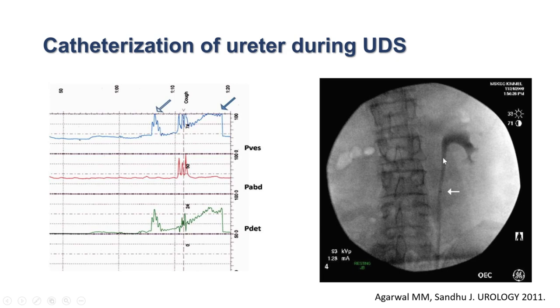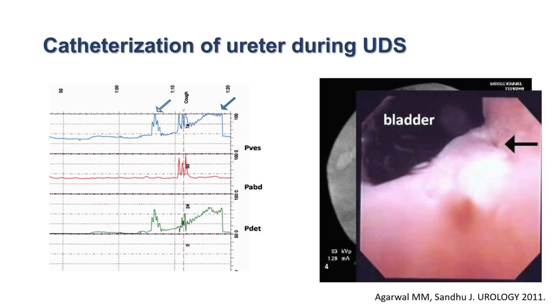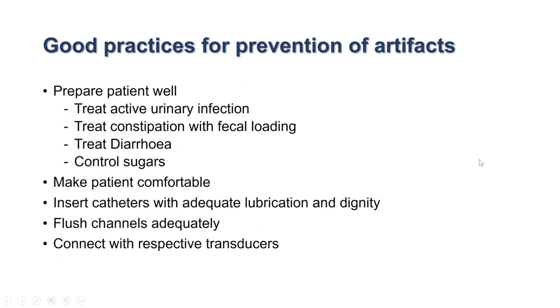immediate X-ray and found that the urodynamic catheter was actually in the left ureter, and the contrast was filling the pelvis. This was a case of post-radical prostatectomy incontinence evaluation when I was at MSKCC, and we found this strange phenomenon. It actually happened because his ureteric orifice was nearly at the anastomosis.